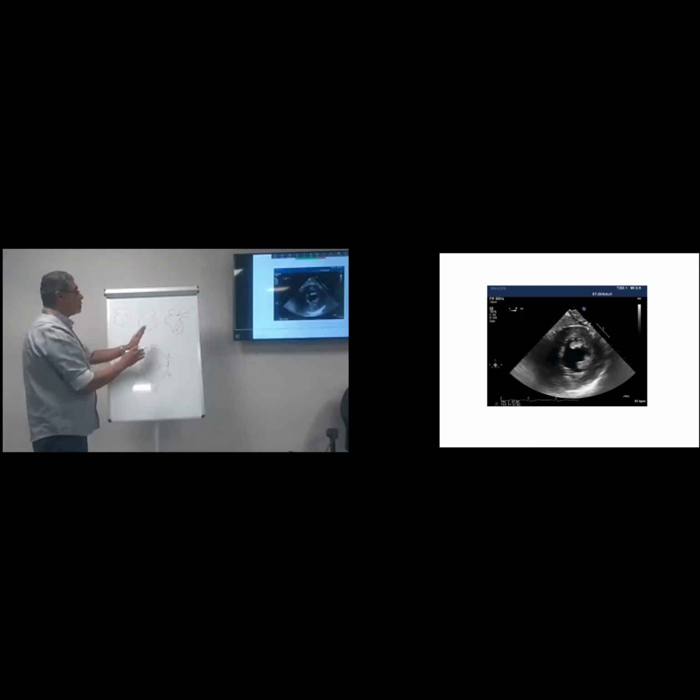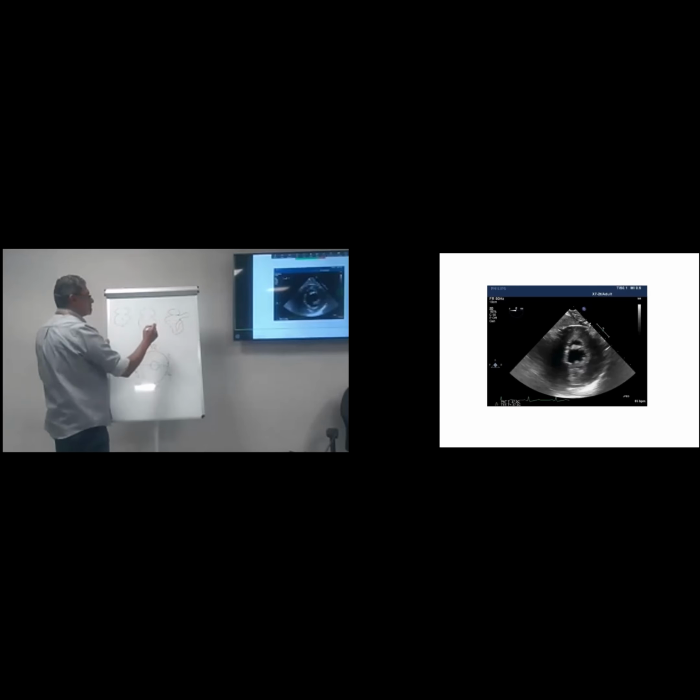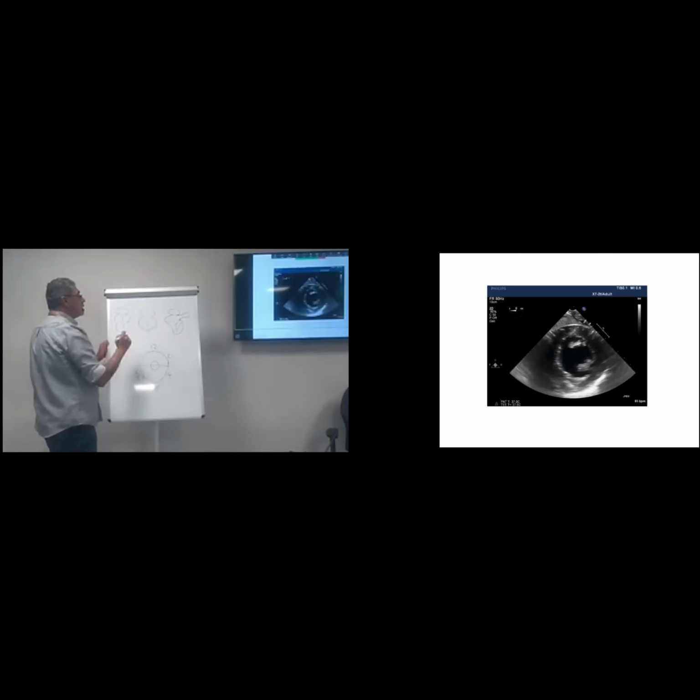Here we mostly get confused about which is which. If we have only 2 chambers in the view, it is a simple name, one word: inferior, anterior. If more than 2 chambers, it is a compound name, like anterolateral or inferolateral. The same as here.